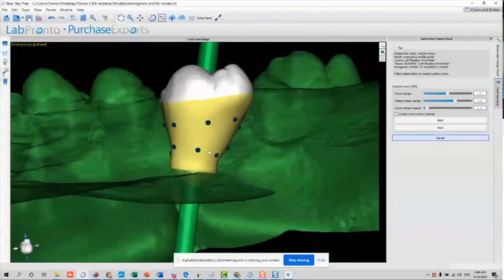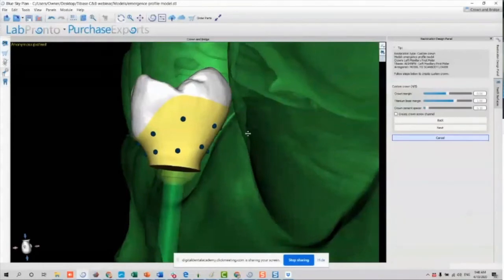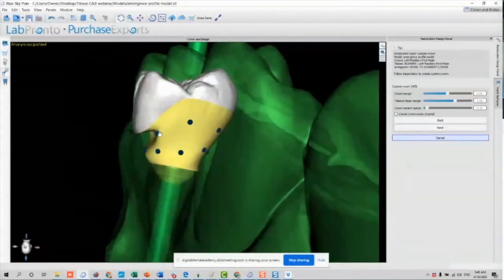So this is how you're going to plan your implants from the crown perspective, okay? And this, of course, if your patient or the case allows it, will be the ideal. Otherwise, you can also create all this with the same principle, having a concave shape area and then convex, okay? But what you do not want is to have a very marked area like this.